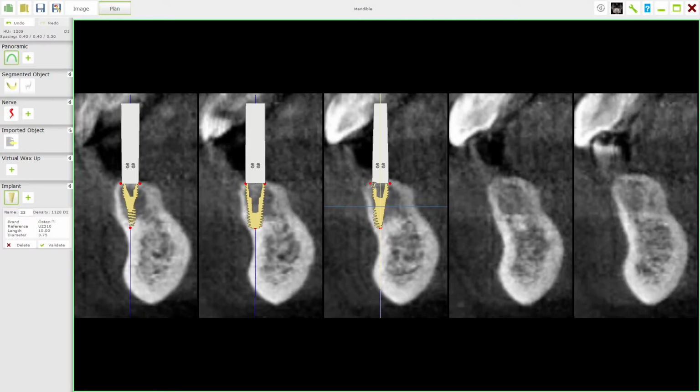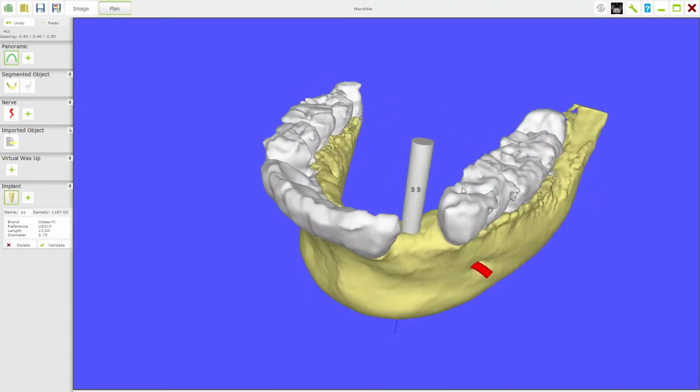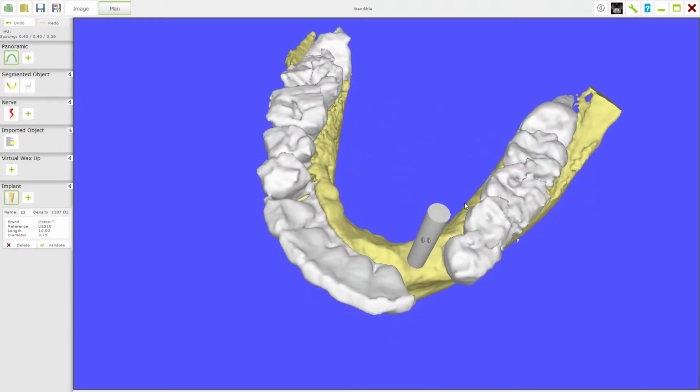Ideally you want to have 2 millimeters of bone on the labial aspect of your implant, and this gives you a very stable implant. It also gives you a very stable soft tissue contour. You see how the trajectory of this person's mandible is. This person's got quite a prognathic mandible. And we are going to look at this again. And we'd really like to have that further out, wouldn't we, guys? We'd really like to have that a bit further out.